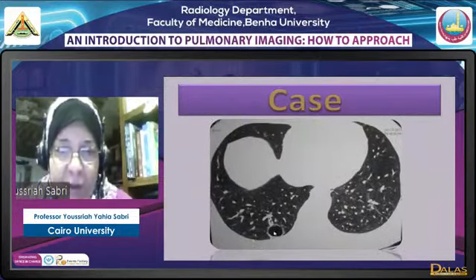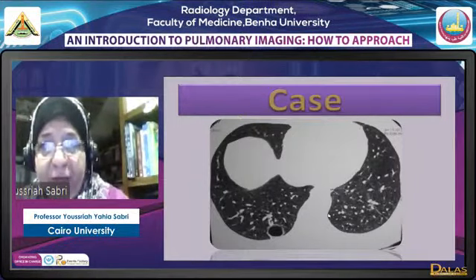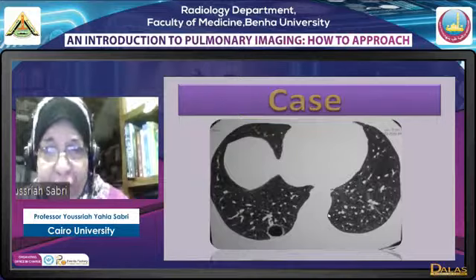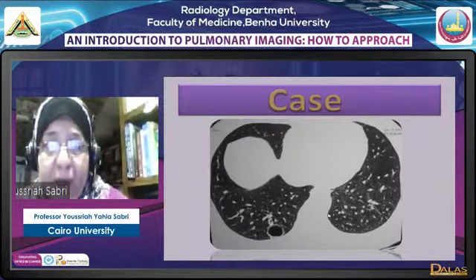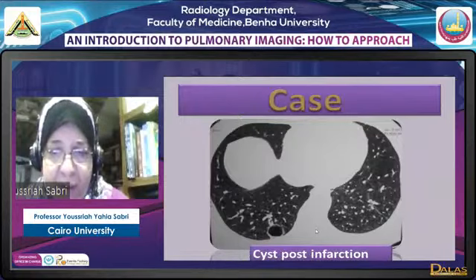Here, this cyst was healing infarction. When a patient has an infarction, it might heal by total resolution or leaving a nodule, a fibrotic nodule, or a fibrotic parenchymal band, or leaving a cyst, as you can see here. This is a cyst which is post-infarction.